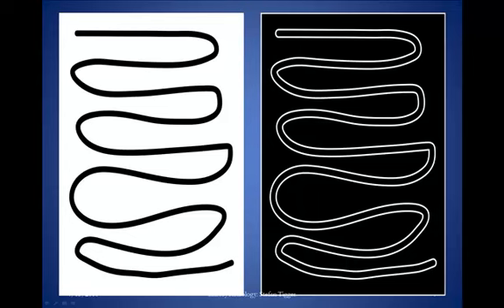Now why is that? On the left is supposed to be a loop of bowel with air only in the bowel and no air outside the bowel. So basically the only place where you're going to have air is inside the bowel. Outside the bowel you're going to have nothing but soft tissue density. On the right is supposed to be a schematic of what air both inside and outside the bowel wall looks like. That's a length of bowel there, and inside the walls of the bowel there's air, the black stuff, and on the outside of the bowel there's also black material, in other words air. So you'll be able to see both the inner wall and the outer wall of the bowel in somebody who has free intra-abdominal air.